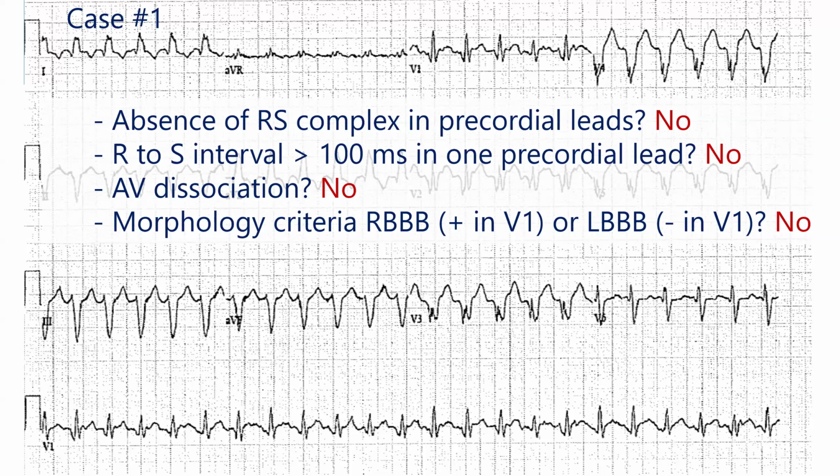And when you think about the morphology here, you're negative in 2, 3 and aVF. So it's a formal possibility that that scar, which is at the apex or at the bottom of the heart, if you will, could, if this is VT emanating from there, it would be going from the bottom to the top, right? Therefore, the axis would be negative in the inferior limb leads. So this morphology is not unexpected for a ventricular arrhythmia coming from towards the apex.